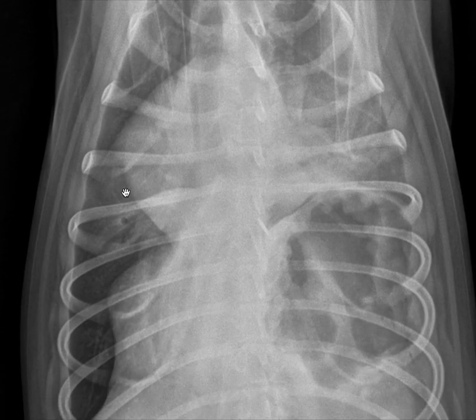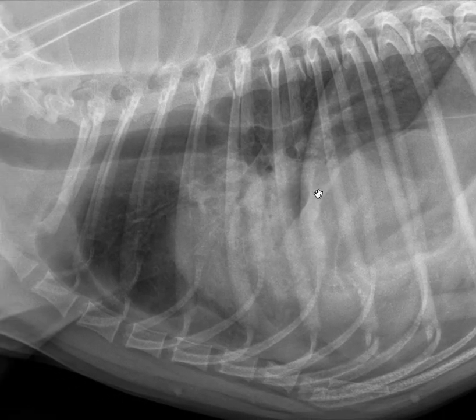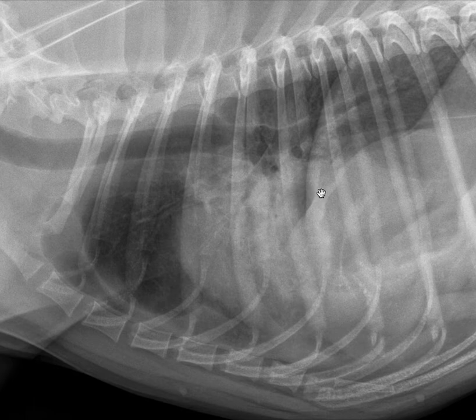I keep all of these findings in my head when I go back to the lateral view and try to corroborate. This is a right lateral view, which tells me that what I'm seeing is a better view of the left lung. And I can see that again, my impression is that there's a focal alveolar pattern, increased opacity, faint air bronchogram, no real ability to see the pulmonary blood vessels in this region.